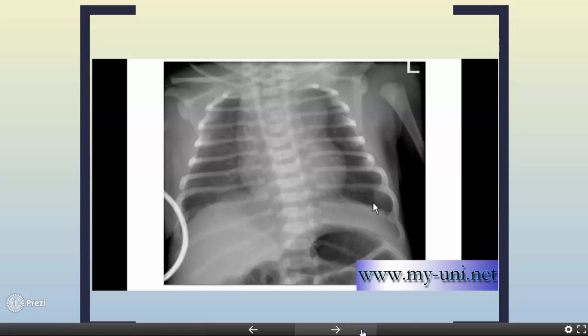You can also see areas that have absorbed far less radiation as compared to bones. For example, air in lungs and intestines and in stomach. But for now, I simply want you to keep normal bone density in mind.